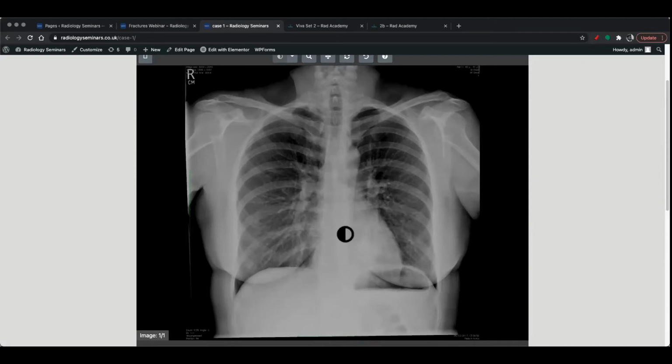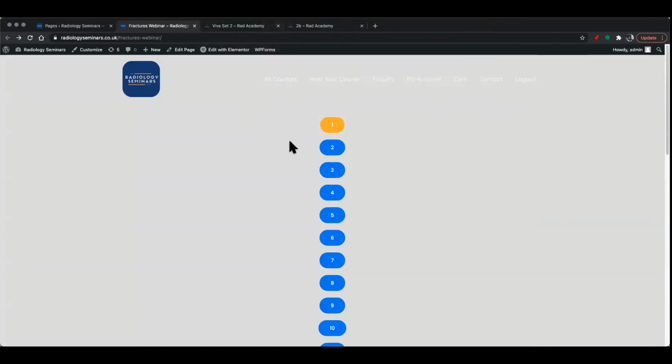If you don't have a check system, use mine. It's looking at the lung apices, look at the mediastinum, look at the costophrenic angles, and look under the hemidiaphragms as well, and obviously behind the heart for any nasty surprises that can happen. So good, well done. Someone did get that, that's really good.